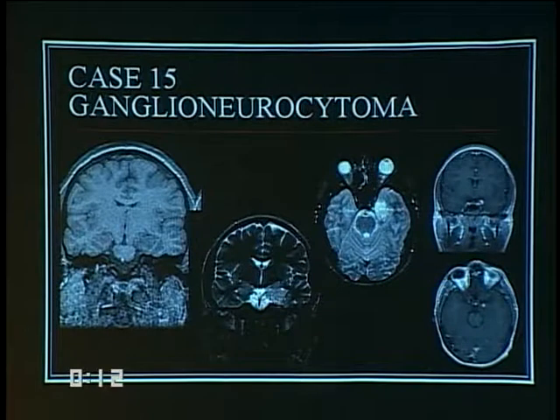This was a ganglioneurocytoma. The hint I gave you was to hopefully make you think that this was not herpes encephalitis. Herpes encephalitis is typical to involve the mesial temporal lobe, and so it's part of this differential, and it's certainly something you should think about. But in an otherwise normal patient, and probably someone that's had a seizure disorder for many years, a low-grade tumor is far and away the leading consideration here.